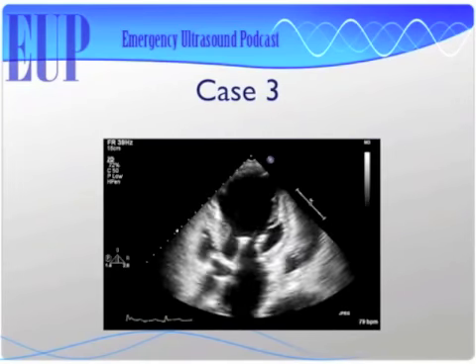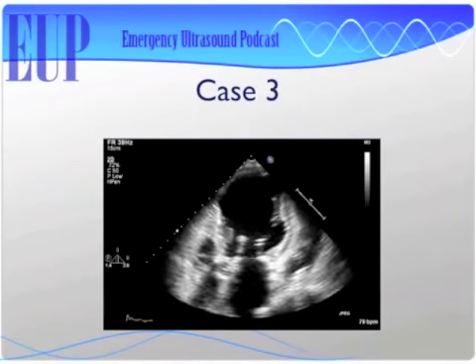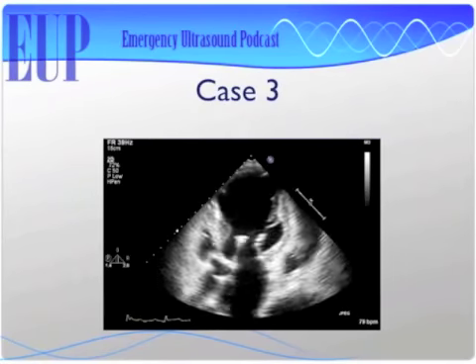All right, case 3. So to round it out here, this is our last case, Matt. So you're going to be off the hot seat soon. So what are we looking at now?